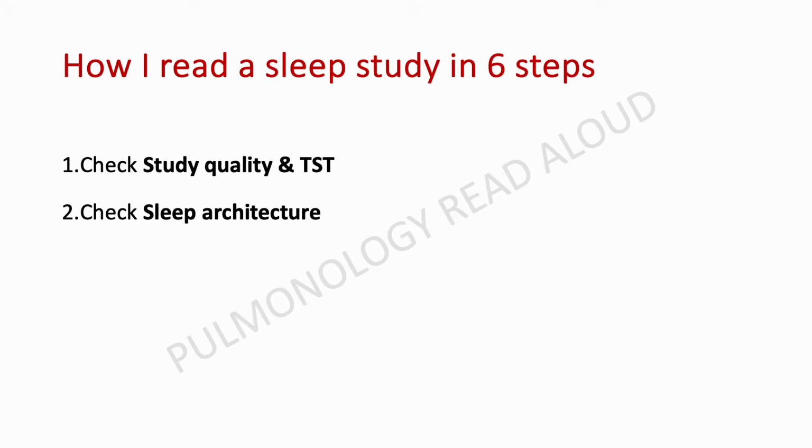The second thing that I would look for is the sleep architecture. So when we are scoring the report, we usually go ahead and do the stage scoring first before we go on to look at the respiratory summary.